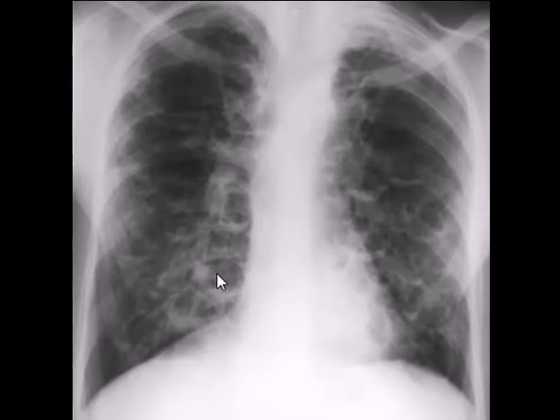Please note that normal diameter of trachea should be between 21 to 27 millimeters in adults. Right and left main bronchi should be much smaller than trachea in a healthy person, and the branches of bronchial tree should get smaller and smaller in size as they divide. Even each bronchial branch should taper at the distal end. In this case, notice some of these dilated bronchi are bigger than the trachea itself.